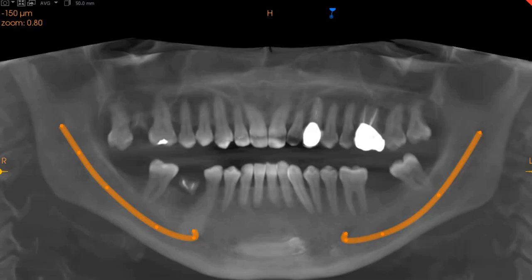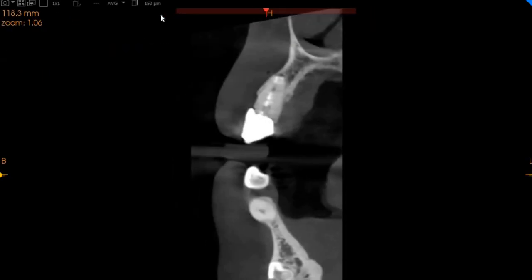As you can see, we've got a crown and endodontic treatment done. This is the transaxial view of the tooth. Unfortunately, we can see that there are multiple voids within the root canal system. There we go, that's one. That's two. We see a very slight bit of periapical periodontal ligament thickening, but other than that, we see major voids. We can't see any cracks on this view.